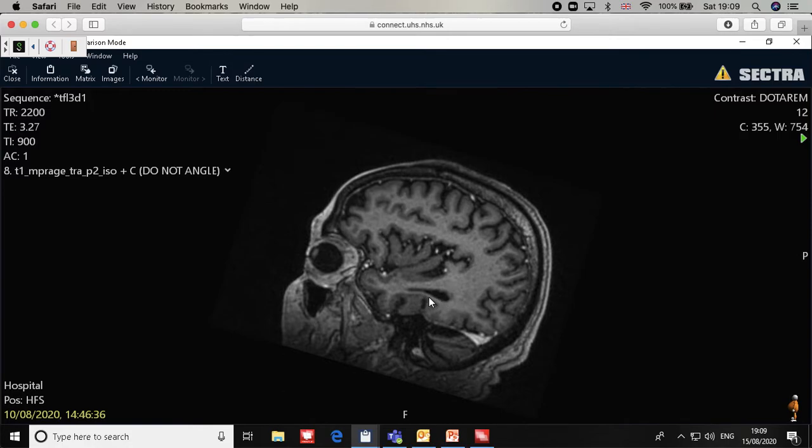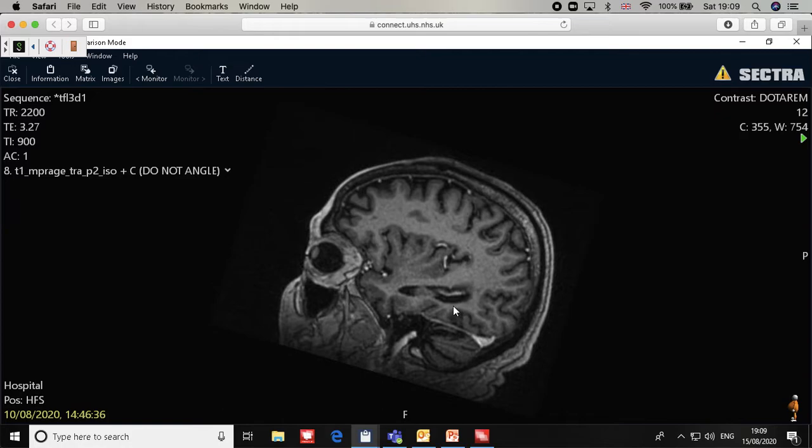So there is no gray matter here; you can see the white matter. Again, we see the white matter or the gray matter in T1, whether it's T1 with contrast or without. Please don't confuse it and go to T2, because the white will be gray and the gray will be white. In T1, the white matter is white and the gray matter is gray, or hypodense. I will not repeat that. So you can see here the gray matter inside the floor of the lateral ventricle. This is the hippocampus.